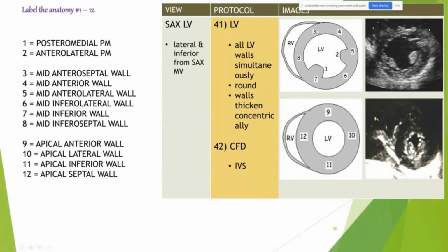So now you get to the mid, right? Anytime, this just tells you where you are. Now, anterior septal, because remember this wall is the septal wall. Anterior lateral, remember this is the lateral wall, right? So I want you guys to start linking these keys together so you can remember this no matter what. Again, for me, anti late in September.